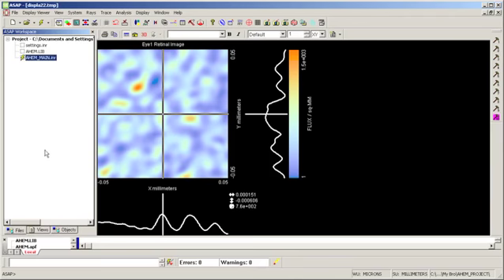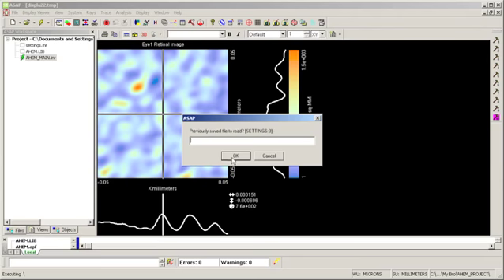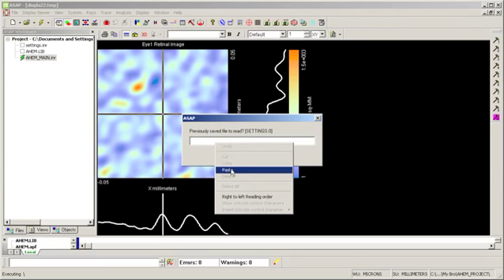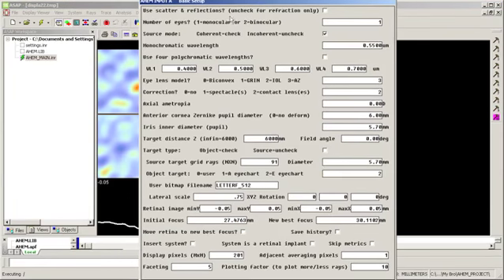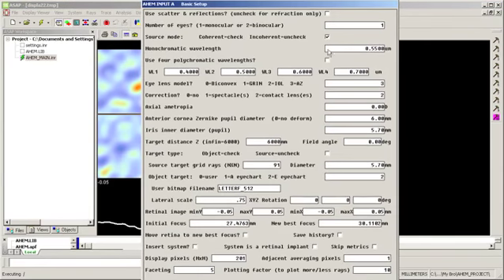So we're going to load up AHEM. I've got a settings file with a contact lens, and I go to AHEM and my basic setup. So now when I go to correction, contact lens or lenses if I had two eyes, and the rest of my setup is fairly standard, and I'm also using a coherent application here.